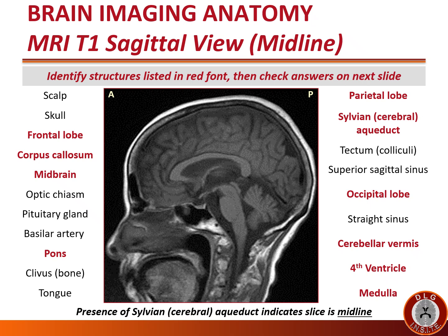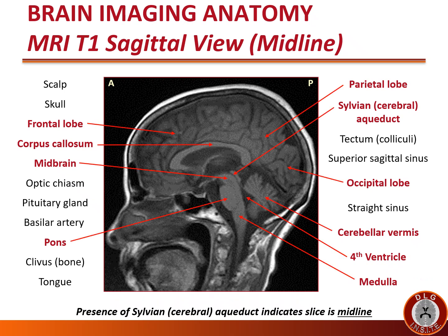Please pause for a moment, identify all the structures listed in red font, and then check your answers on the next slide. Please spend some time on this slide carefully reviewing the correct locations of the structures listed in red font.